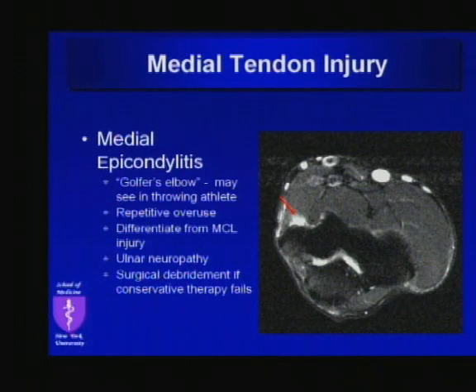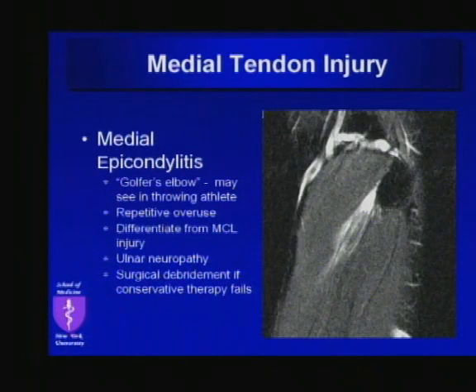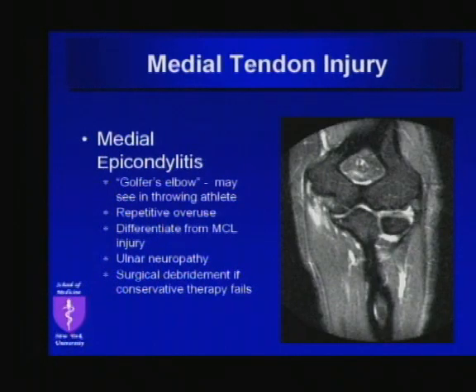I'm going to make a plea here not to ignore your sagittal images. The sagittals can really be very helpful. Go all the way out medially, especially if you have a fluid-sensitive sequence, and you're going to see it beautifully there, partial detachment of the common flexor tendon. Okay? Just to show you another case, a little more subtle in this particular case on the fluid-sensitive sequence.